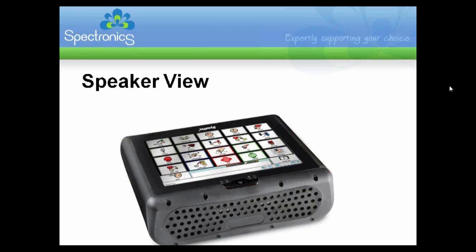We've got the speaker view, which just shows the top part of the device where the speaker holes are. You also have fans within the device that cool the device down, and just at the base of the speaker holes you can see a large plastic area, which is the infrared port on that side.